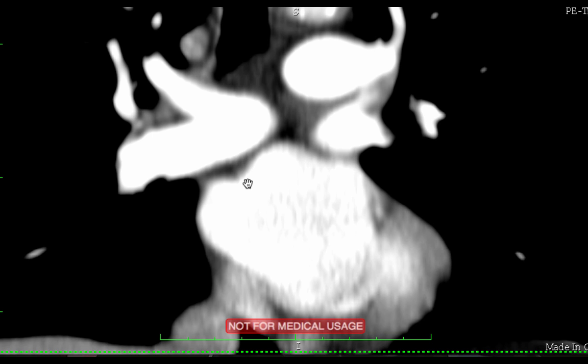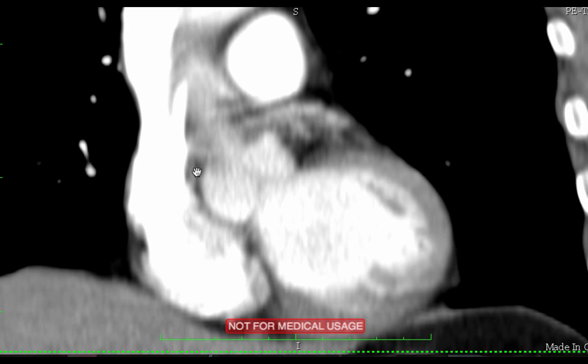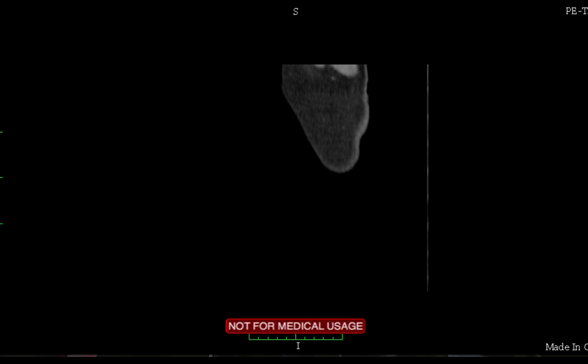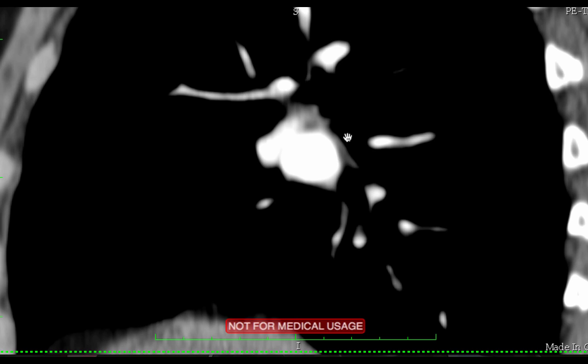Kind of a little bit difficult to put together because it's not a nice schematic, but you guys hopefully have seen the schematic of how blood flows, and if you need a description of those basics, I'll be glad to present you one that you can understand pretty easily. Okay, so we have reviewed it in axial and coronal planes. Sagittal can be a little bit tricky. Sagittal is usually good for problem solving, but not that good for getting an orientation.